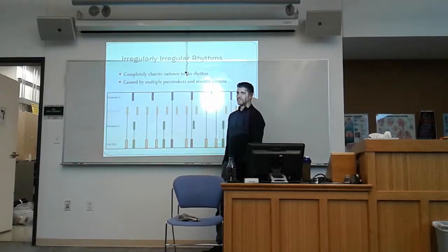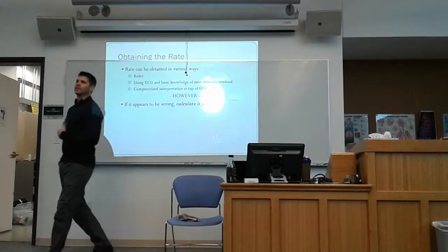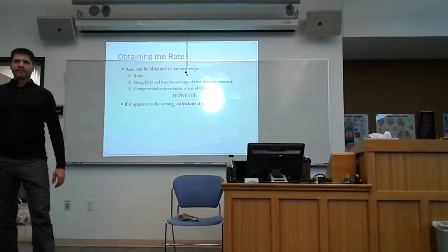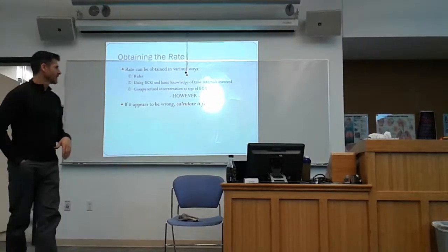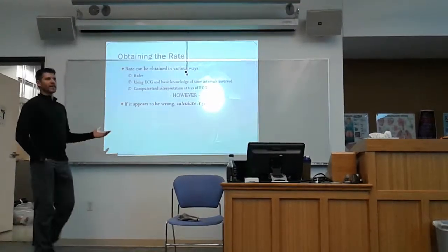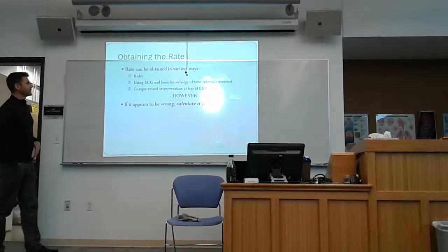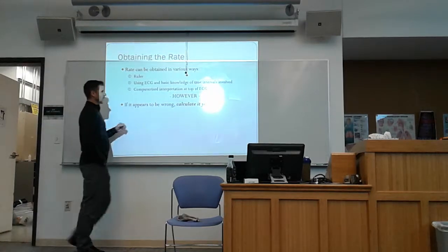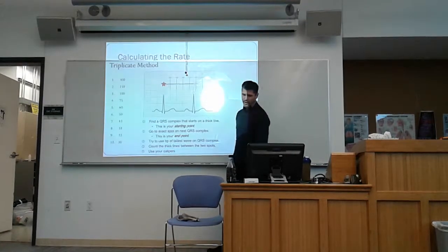We good on rhythm? What comes after rhythm? Right. Rate. So now we're looking at your rate. There's many different ways that you can establish the rate. Some are memorizations, some are mathematical. They're all mathematical in the end, but there's many different ways that we can try to figure it out. You'll need to be able to calculate it yourself, and there's a few different ways.